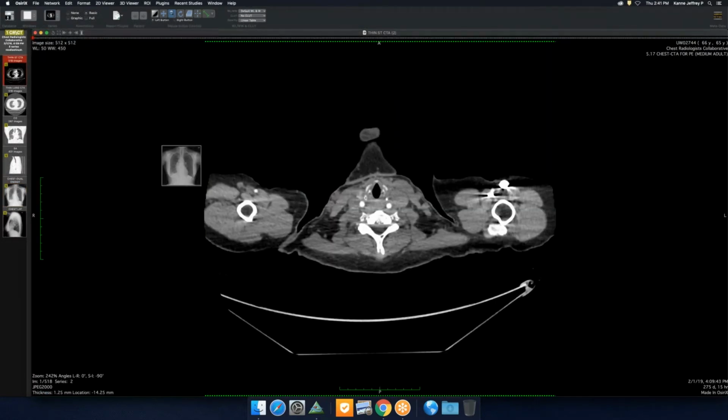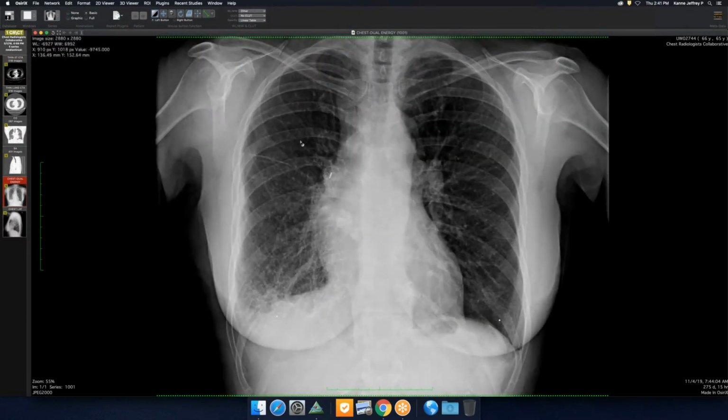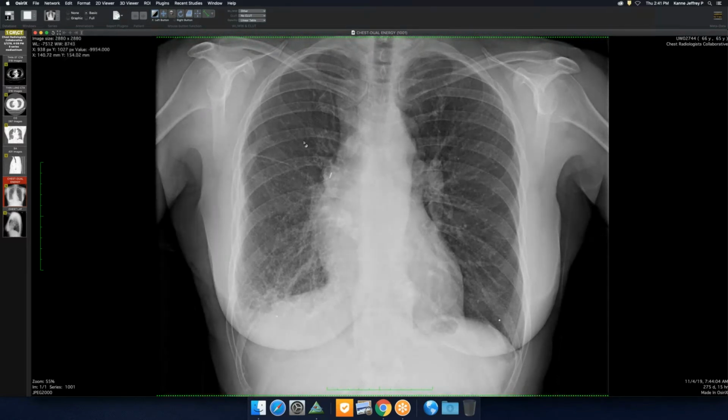Before you go on, Jeff, can you go back one second? I just want to look at something else. Is there something abnormal related to the aortic arch around it and/or in the lung? Because if there is, one would think maybe collaterals. Oh, yeah. I'm thinking of a certain thing, and I wonder if we're seeing potentially collateral vessels. Something's odd about that, and the aortic. That's a good point. It might be something. You'll see in a moment if there are abnormal vessels, mediastinal or otherwise there.